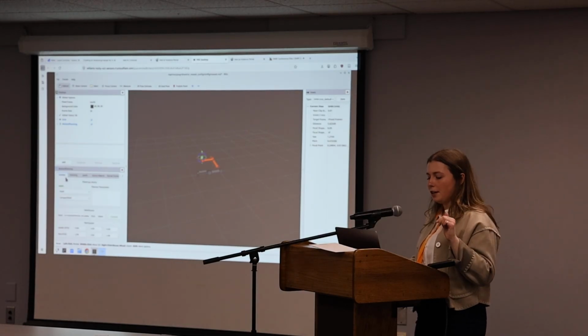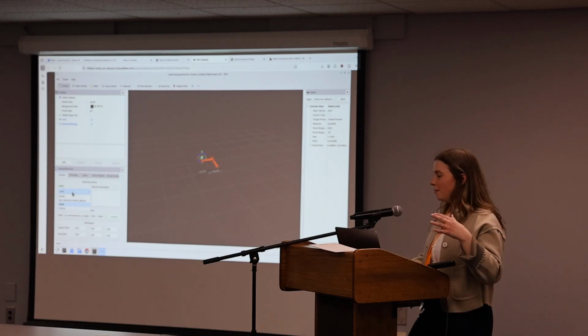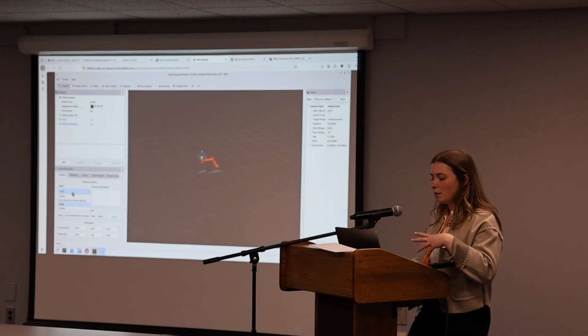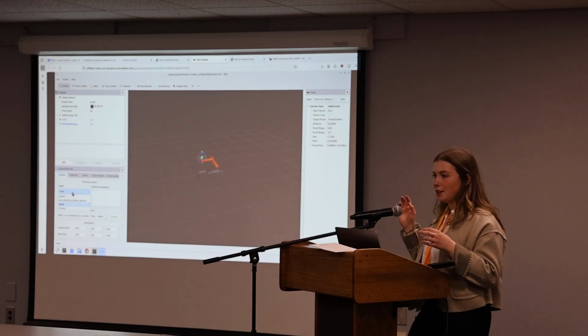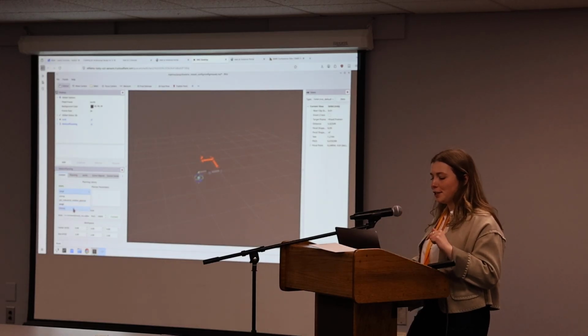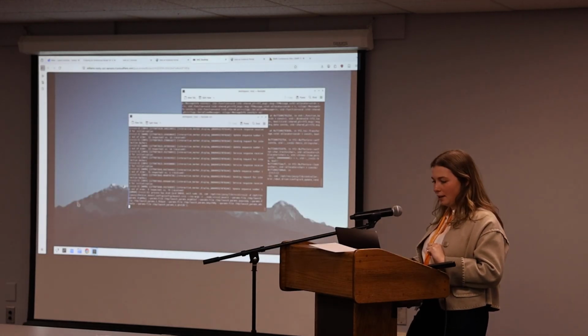Okay, so quickly, you're going to switch to the context tab. If you've used MoveIt a little bit, these are the actual planning libraries. I found OMPL would make the robot do a crazy trajectory to get to one spot. So if you switch to CHOMP for both of these, I think that works better. You can just do that quickly.